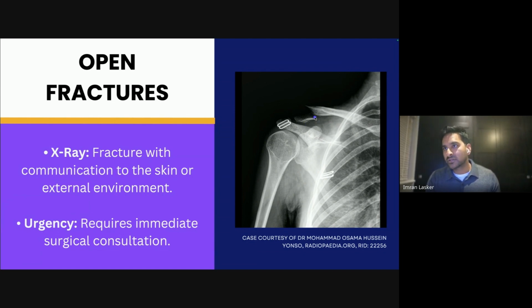Now, one thing I just want to show you again, remember how I said it gets very sclerotic as you get to edges of normal bone? In this one you can see there's no whiteness at all to the edges. So this is a complete fracture, right? And it's a fracture because, first off, you can see it's not lined anymore. And you can also see that there's a complete sudden transition from normal bone to complete nothingness. And I wonder whether they probably had some ligamentous injury here because that doesn't quite align anymore.